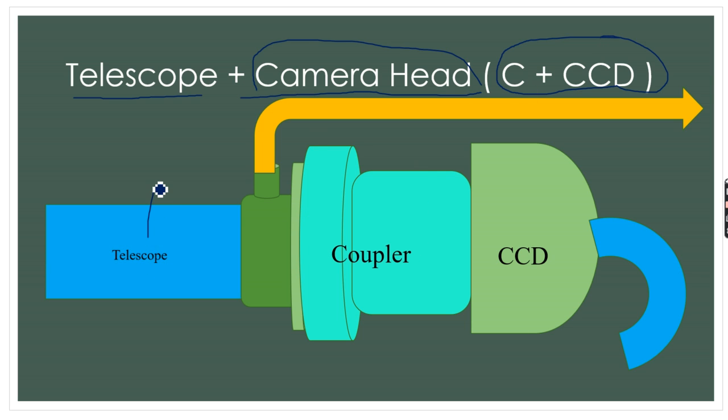Here, this is the shaft of the telescope. This is the light adapter. This is the light cable. And here some more light sources we have already discussed.